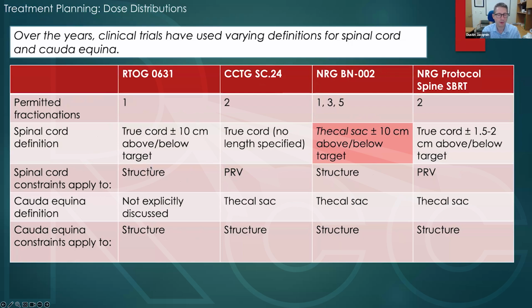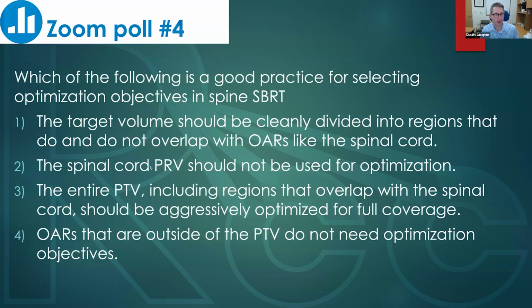But it kind of shows what variety is out there in terms of how the cord is defined and how different dose objectives are applied. And so the takeaway, I think, is just be really, really aware of what your clinic is doing and be very, very intentional in making sure it's done correctly.